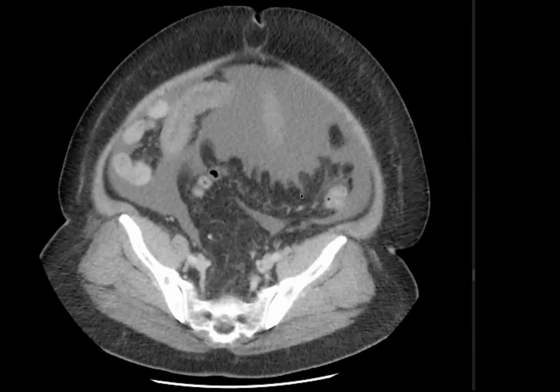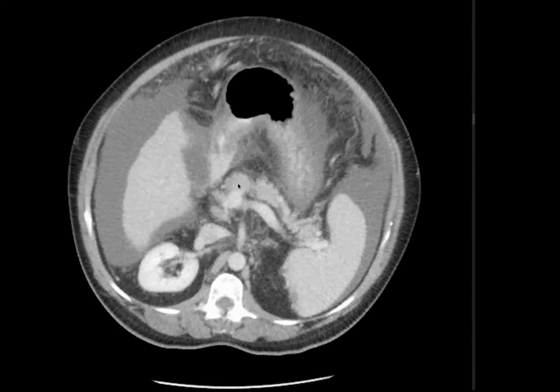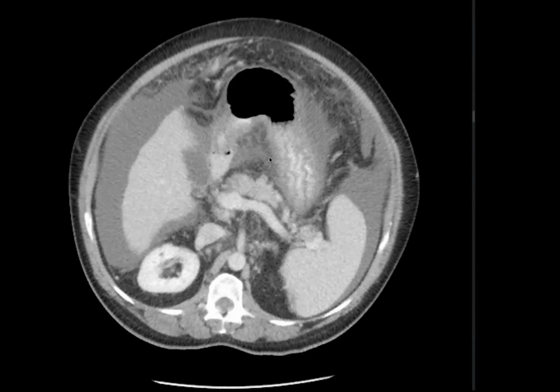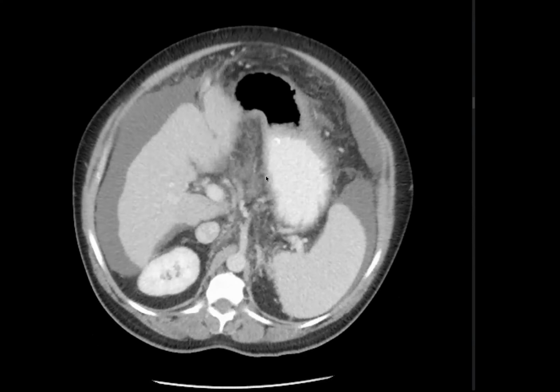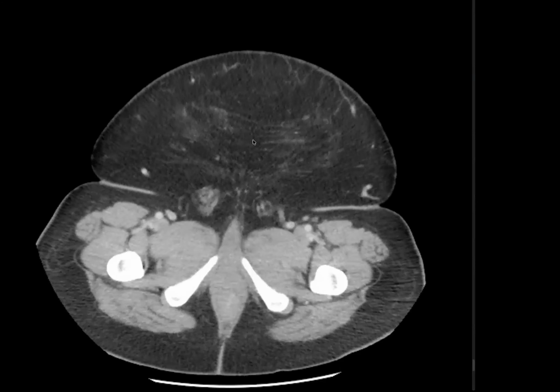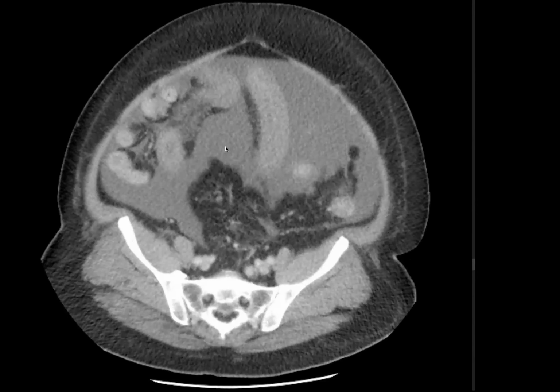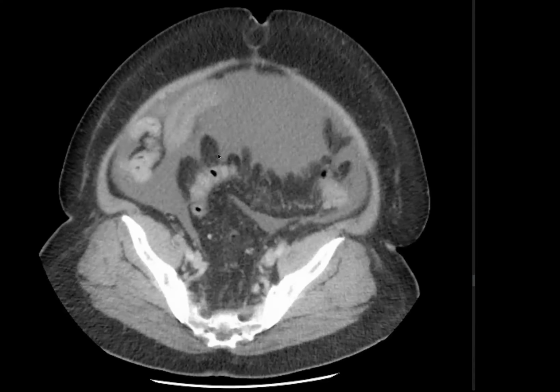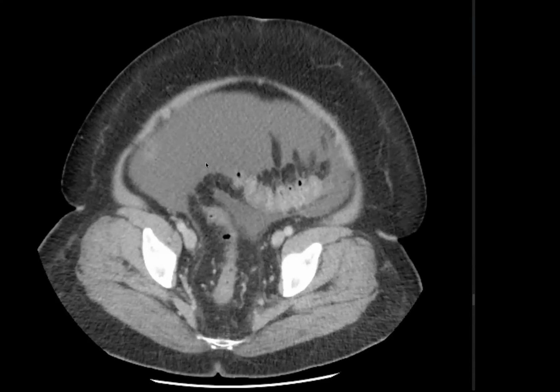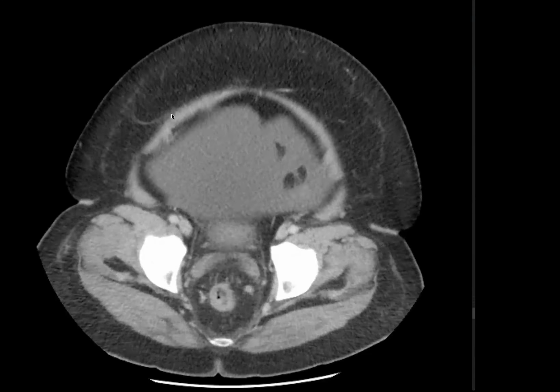So this was a standard on-call emergency case where there is superior mesenteric vein thrombus with bowel ischemia. The differentials are obviously arterial ischemia and non-occlusive ischemia, and since there is no small bowel obstruction, you rule out the other abdominal emergencies. But since it's time critical, you will be expected to inform the vascular team, tell them that there is ongoing or impending bowel ischemia, and then the rest, you know how to deal with. So this was the bowel case.